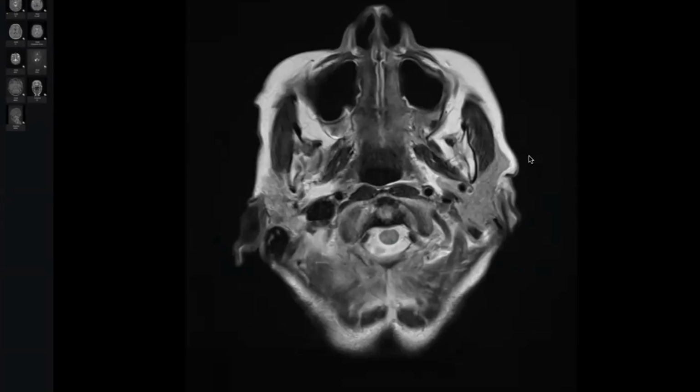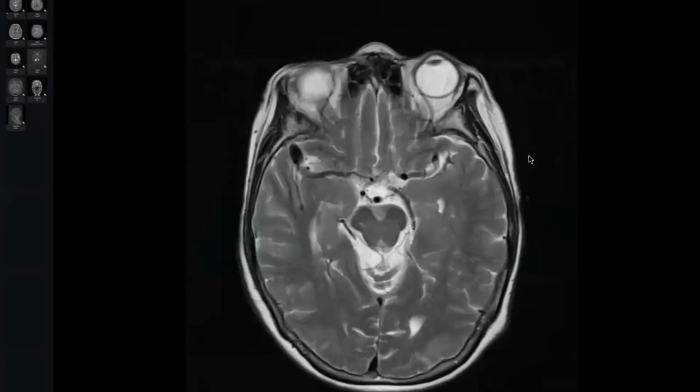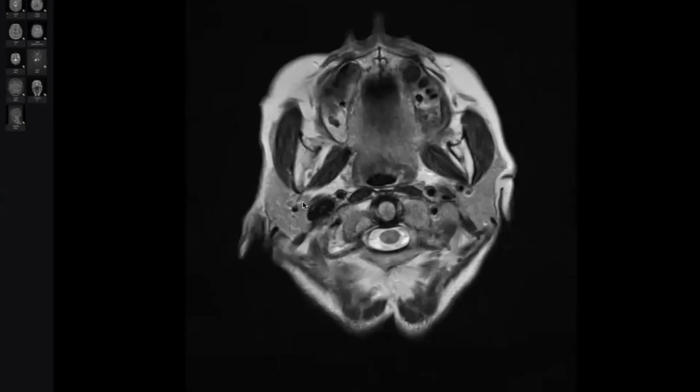The other scrolling down is the search for review areas. So we will divide the brain into two scrolling rounds. First one, parenchyma and ventricle, and the most common structures like the subarachnoid spaces. But the most important is the second round.